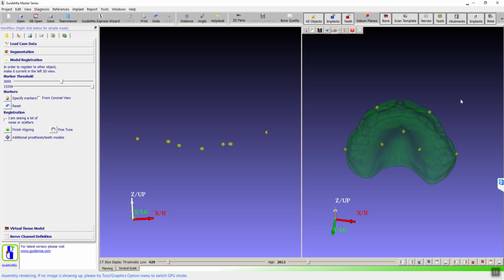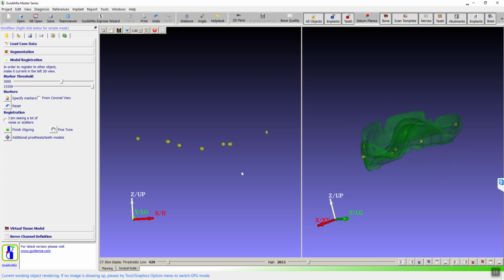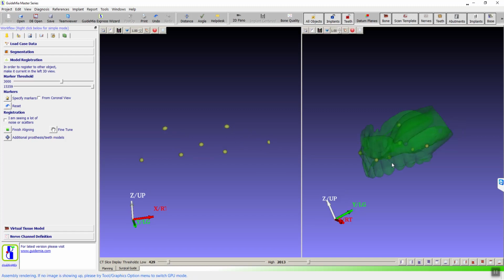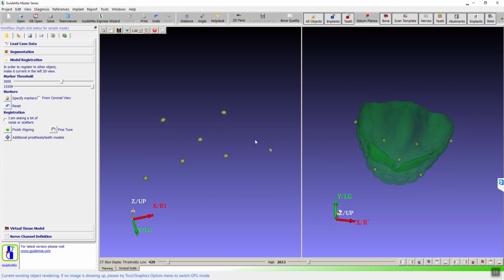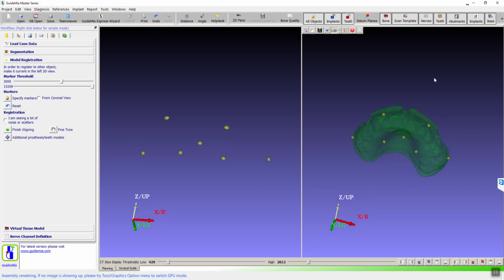So those are the markers. So we are sure they are in a similar plane. Yep, right. Frank, there is no slot or anything in that. Those are just stick-on shear markers. Okay, I see. I wonder if they're so perfectly coplanar that it's some artifact of the CT scanner. Yeah, I think a lot of the issues are with our CT scanner. It's quite regular, I would say.